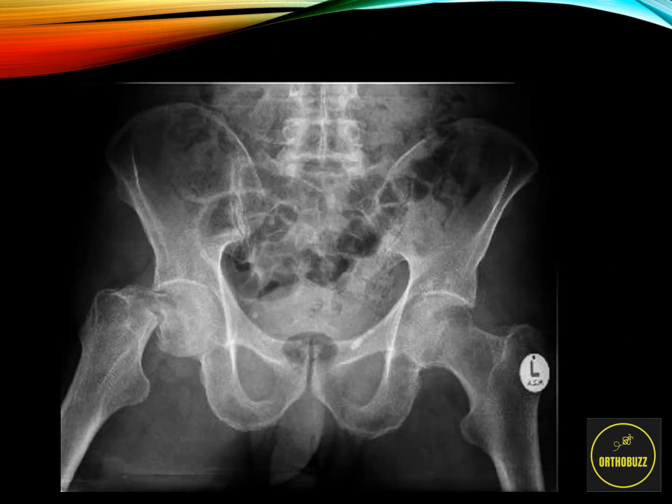As we can see, this is an AP pelvic radiograph. Now let's assume this is the correct patient, the correct date, the correct X-ray, and that we're happy with the technical quality of this film. As we can see, the entire pelvis, the proximal femora, and the lower aspect of the lumbar spine as well. The main abnormality is a right neck of femur fracture.